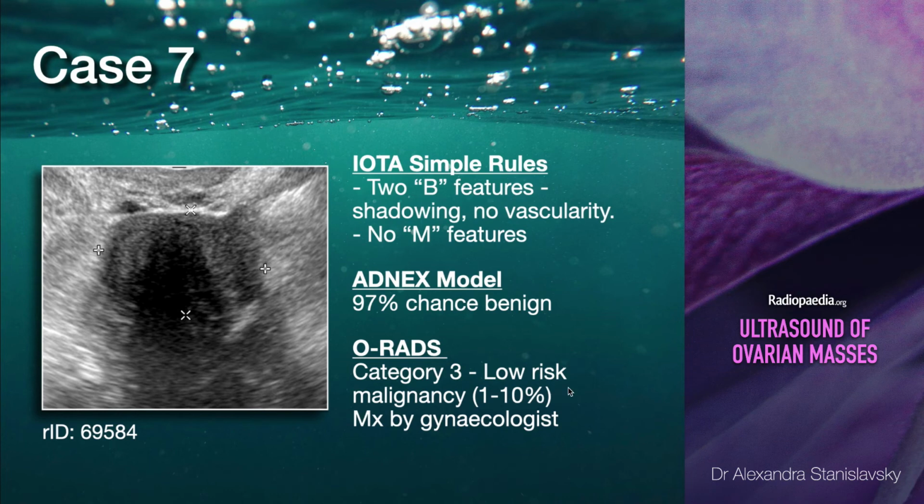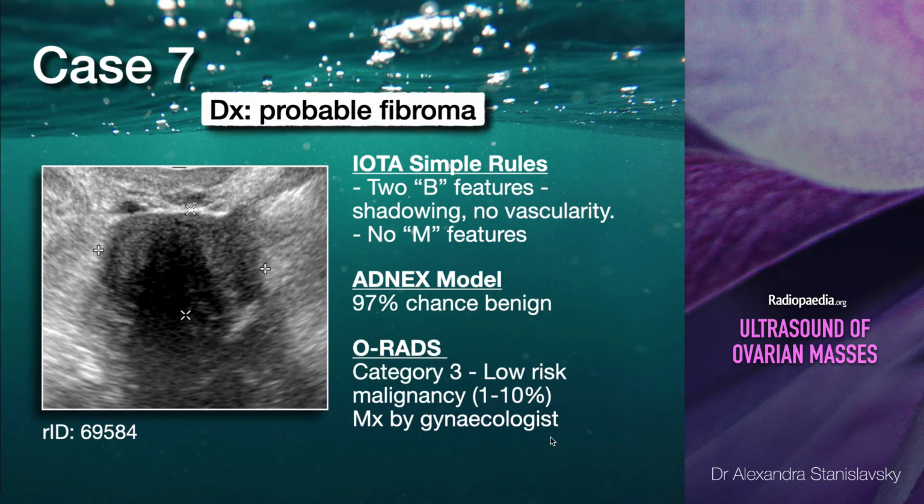And O-RADS also low risk of malignancy, 1 to 10%, management by gynecologists, which is what we'd already discussed from our clinical opinion as well. So a diagnosis of probable fibroma, probable because this tumor was never excised, and it was followed up and it was stable.